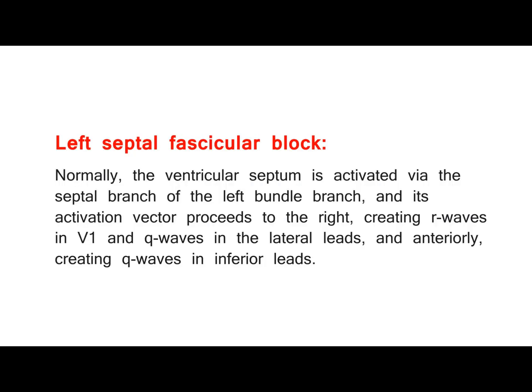Left septal fascicular block. Normally, the ventricular septum is activated via the septal branch of the left bundle branch, and its activation vector proceeds to the right, creating R waves in V1 and Q waves in the lateral leads, and anteriorly, creating Q waves in inferior leads.